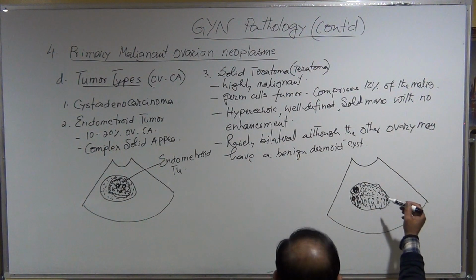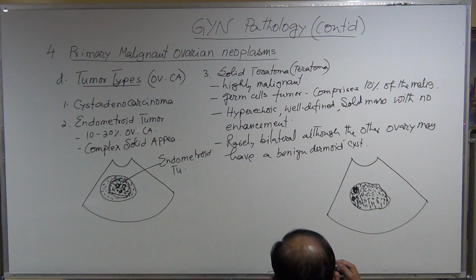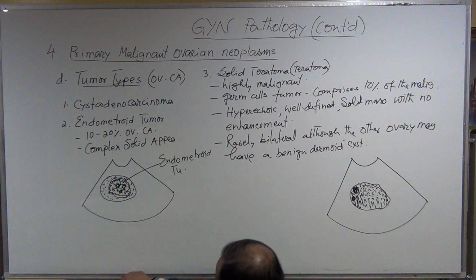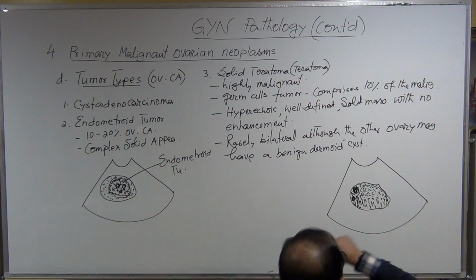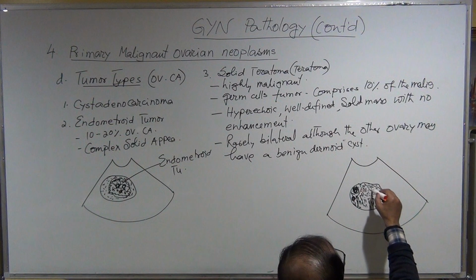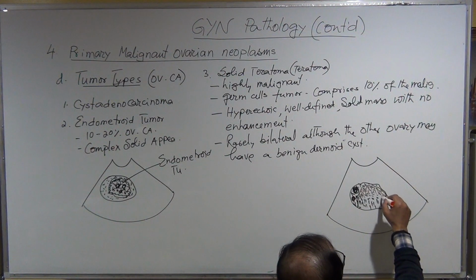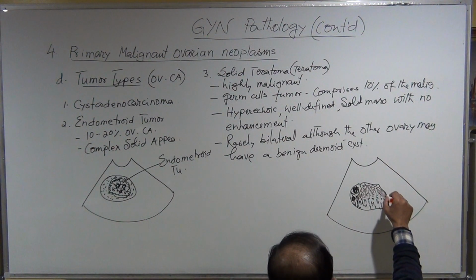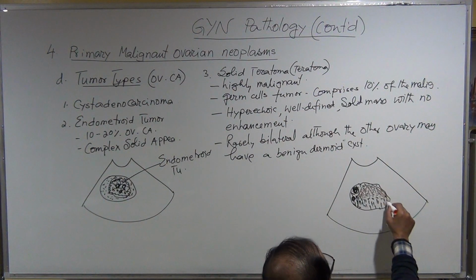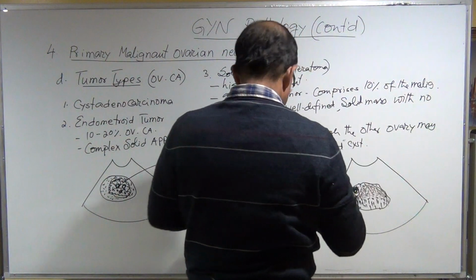No enhancement. Okay, so this is the solid teratoma.